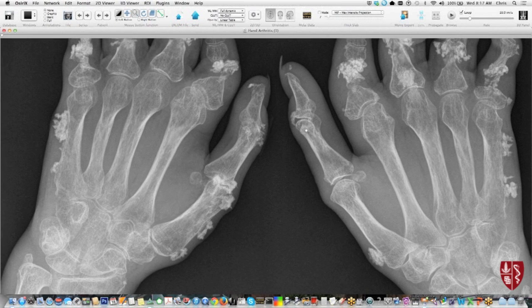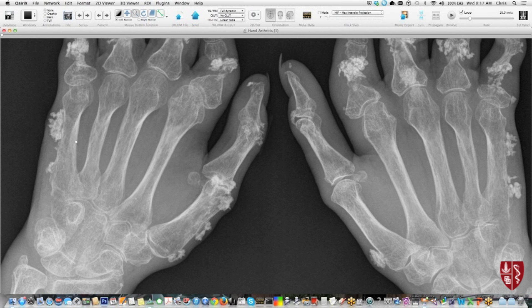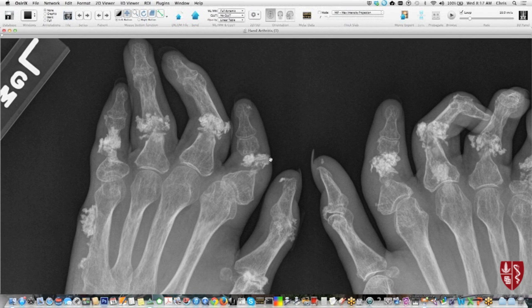This is an example of a patient who has not only these soft tissue calcifications, but a lot of arthropathy here, right? You can see this left second digit, this proximal phalanx really tapers. There's a lot of density in there. You really don't see the joints hardly at all. Now, the things that can cause these really progressive and destructive arthropathies are not that many things.